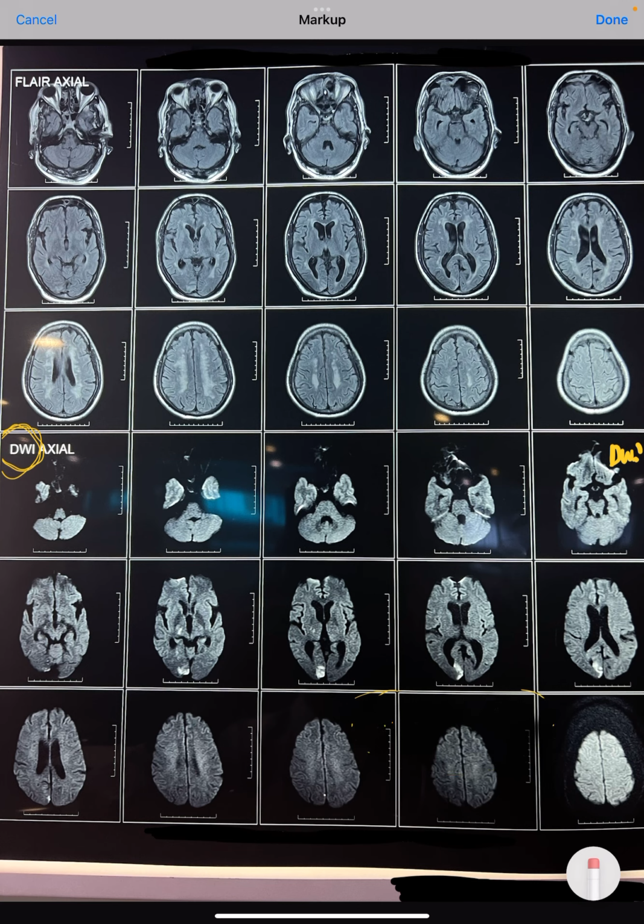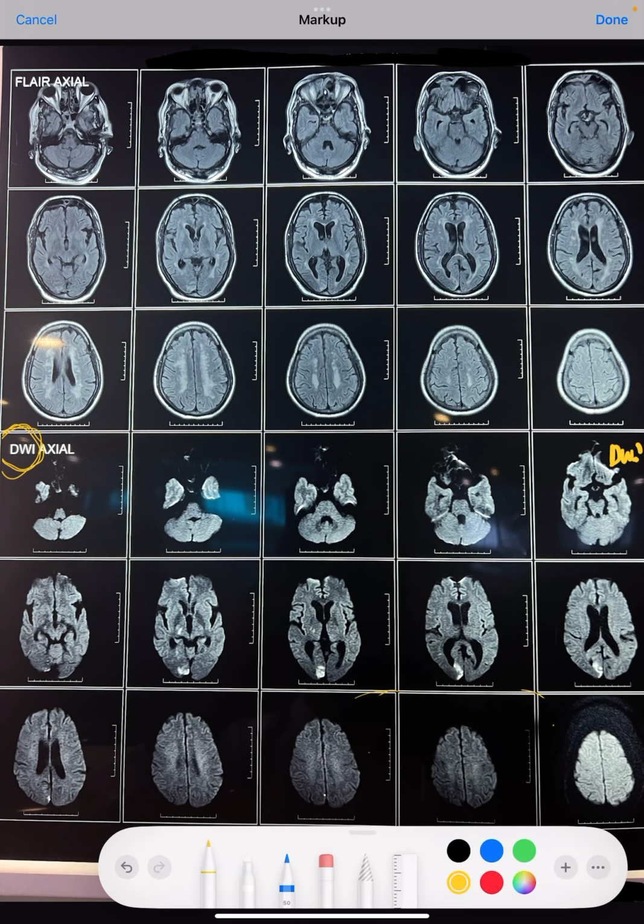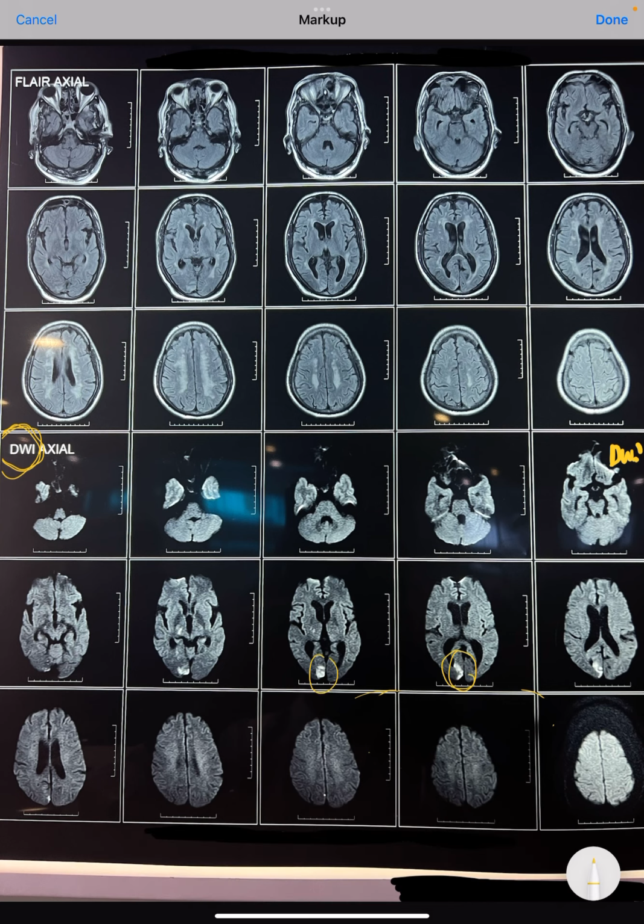Now it will appear hyper intense or dense white. We can very clearly see this on this DWI imaging. So, a very hyper intense or dense white area on DWI, and exactly in the same location, if it appears dense black on ADC, that is apparent diffusion coefficient, we say that the patient has acute ischemic stroke of mostly less than 7 days duration.